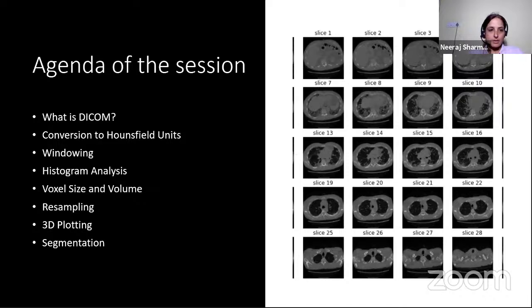Then we will talk about the histogram analysis, and then we will talk about the voxel size and volume, then resampling, 3D plotting, and segmentation.